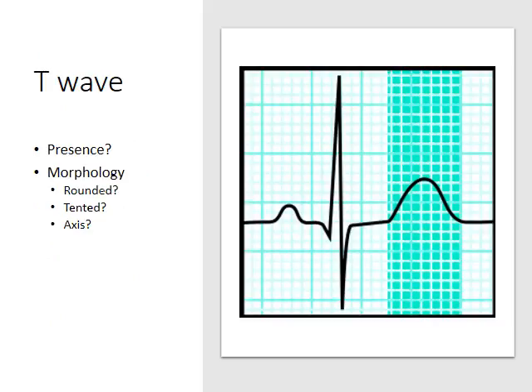The T wave is a representation of ventricular repolarization. It is either positive or negative. The T wave should be in the same direction as the QRS. If the QRS is mostly positive, then the T wave should be positive. If the QRS is mostly negative, then the T wave should be negative. The T wave should be asymmetrical with a slow upstroke and a fast downstroke. Take time to read chapter 14 of Garcia 2015 for a review of T waves.